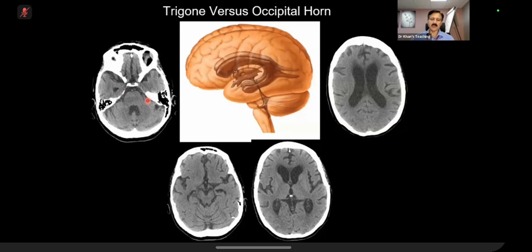You will see when there is transtentorial herniation, one of the things which will happen is that the cerebellopontine angle cistern on the ipsilateral side will become widened as compared to the contralateral side. So in the exam, there can be marks for the description, because the examiner has to discriminate between somebody who will get 6 marks and pass, somebody who will get 6.5 or 7 or 8 marks. So descriptions are important. They are seeing what you are picking up.